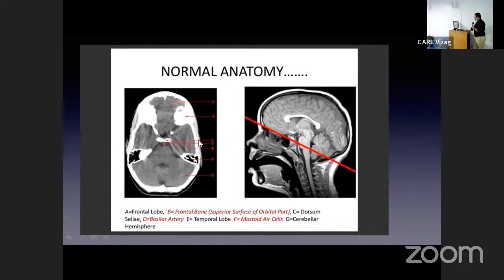And now you see the bulk of the temporal lobes in this cut. The medial temporal lobes, and the uncus is present. In conditions of uncal herniation, we check the CSF spaces at this point to see the uncus.